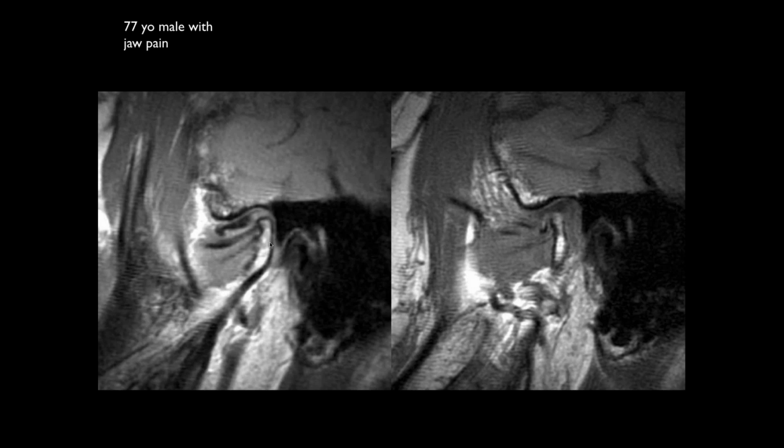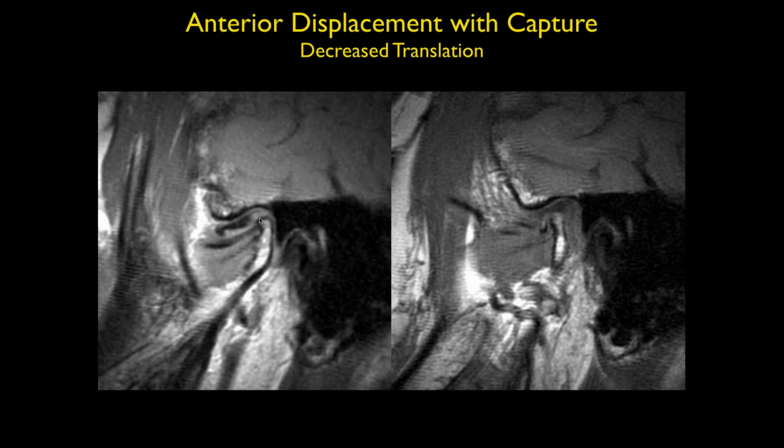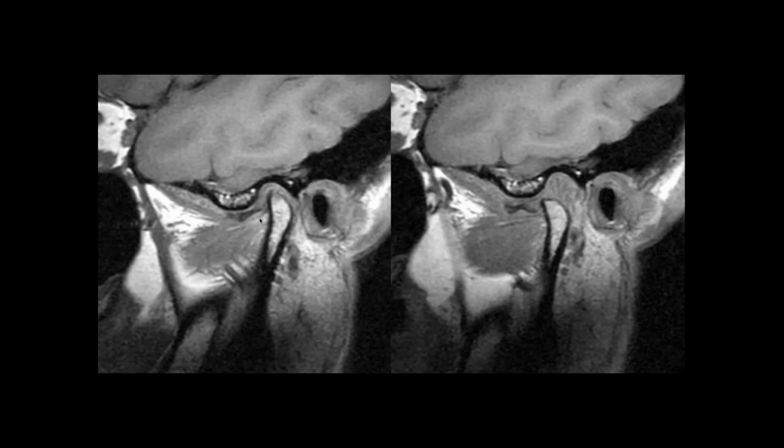Yeah, and if it's small, you certainly have to think about rheumatoid arthritis because it likes it. That's what I was thinking. But we can see that the cortical margins are intact, so we don't see any typical rheumatoid erosions. But, yeah, I don't remember the etiology. We usually don't look at this joint in rheumatoid arthritis. We look every place else.